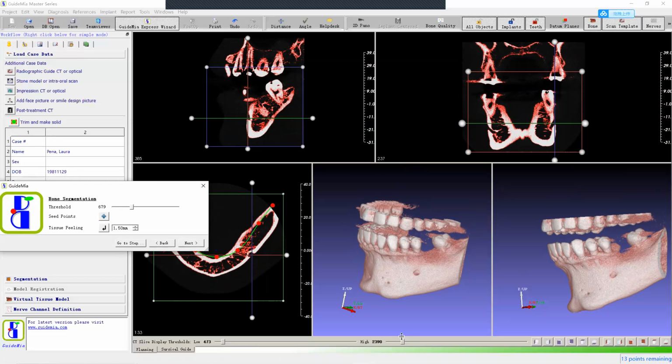But for treatment planning purposes, we take everything higher, everything in the upper range. So we only actually adjust one threshold, which is the lower value. When I adjust this, on the cross-section views, everything above 581 will be shown as red or white.